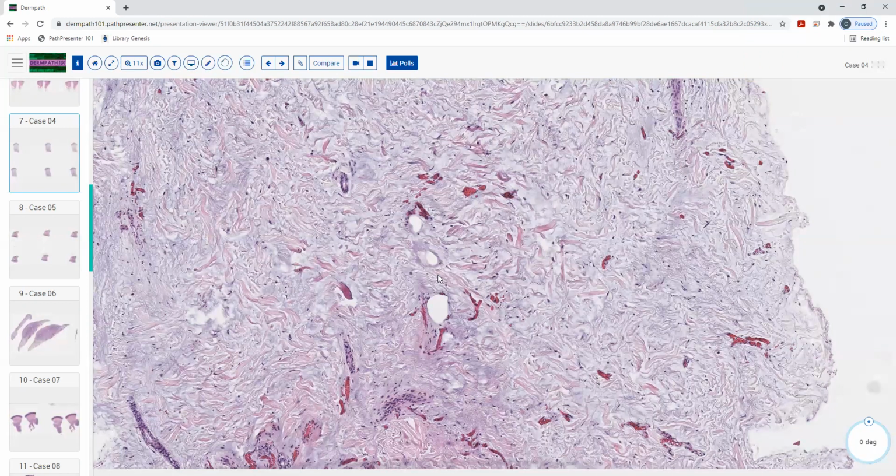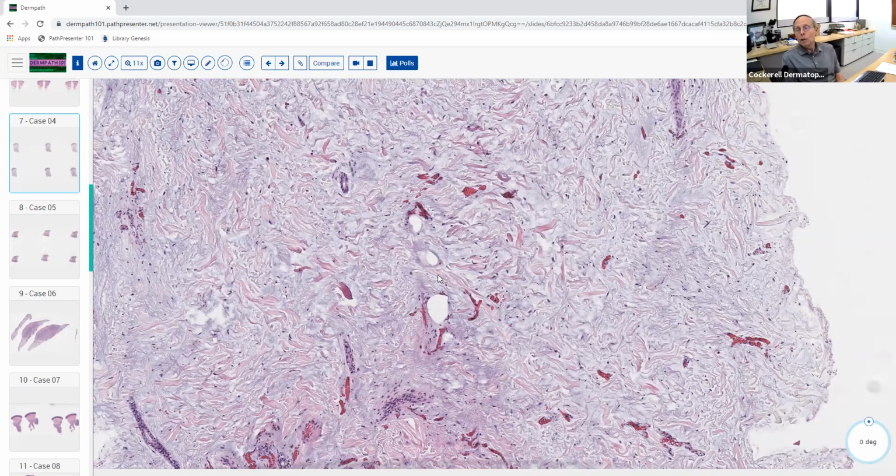I'm not sure what you're getting at. I can think of a mucinous carcinoma, but this doesn't really look like that. No, it wouldn't look like this at all. But something like a myxoid lipoma or a myxoid liposarcoma, there's a myxoid type of malignant fibrous histiocytoma. And sometimes myxoid change in dermatofibrosarcoma protuberans, and you see a lot of mucin in a neurofibroma.